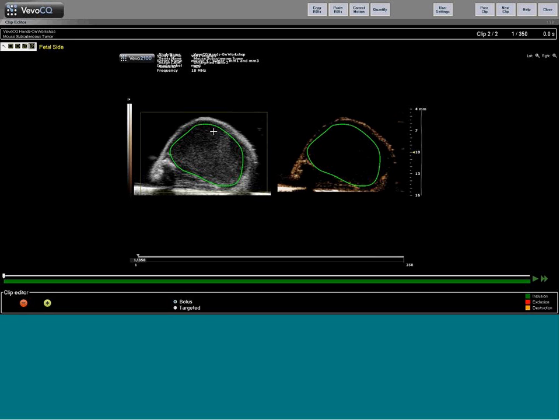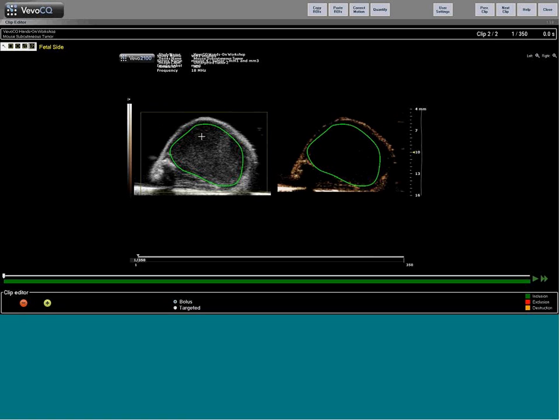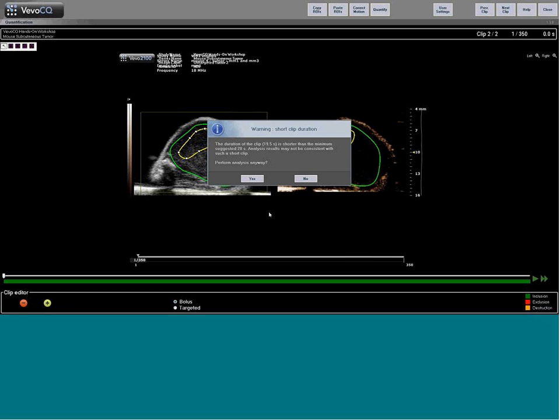I'll go through drawing the region of interest again here in another area. So I'm just picking another region and clicking points here with my mouse as I go. And then when I get close to the origin where I want to close it off, oops, it's jumping around here on me. Let's try that again. Just jumped over to the other one because it was finished analyzing right in the middle of everything here. Here we go. Third time's the charm. So we'll draw a region of interest around here. Double click to close it off. Again, we can make some adjustments here. And once we're happy, we can quantify.